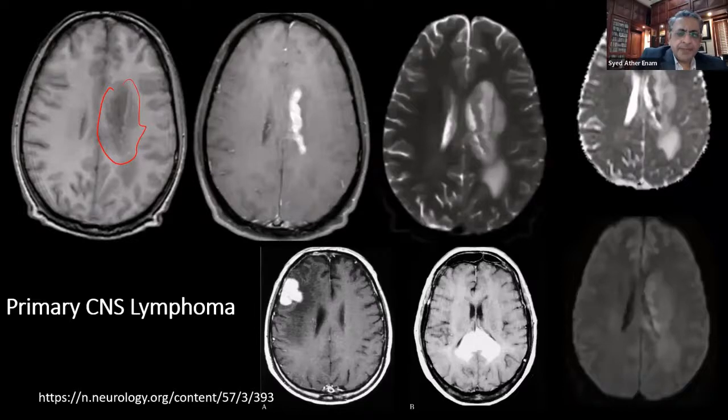Okay, here is another lymphoma, intensely enhancing on the surface. This is T1 with contrast. Look at this one, crossing the midline. You think splenium, it's crossing the splenium, right? So remember the three I told you: GBM, oligodendroglioma, and lymphoma, right? So it's crossing the midline. It has to be lymphoma.